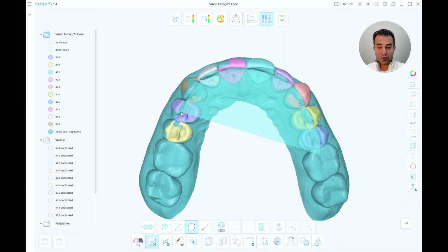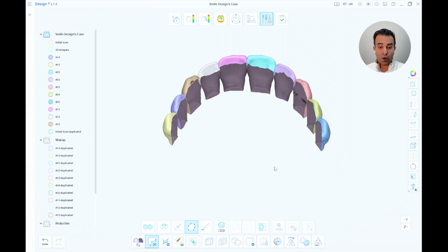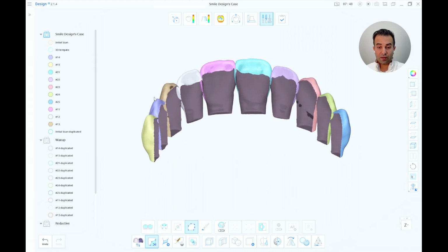So what I'm going to do is select with the polyline this area that I need to delete. You can make the model invisible, then click erase. Now we have holes in the 10 meshes. All we have to do is click fill holes and then apply.